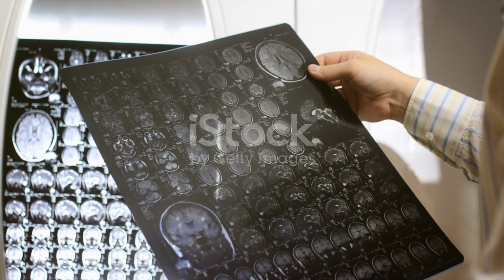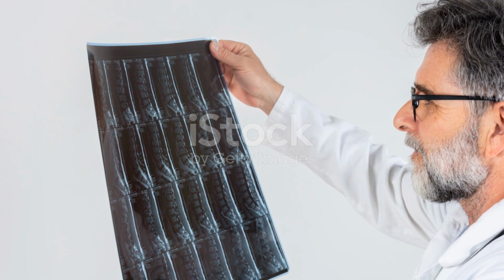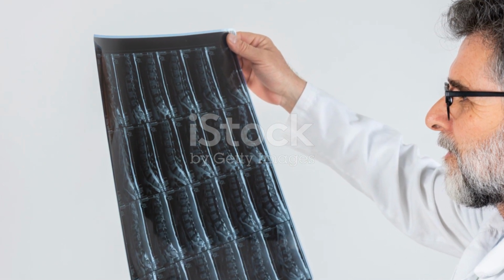I hope this quick overview helps sharpen your diagnostic skills. Being adept at interpreting these MRI findings can make all the difference in patient outcomes.